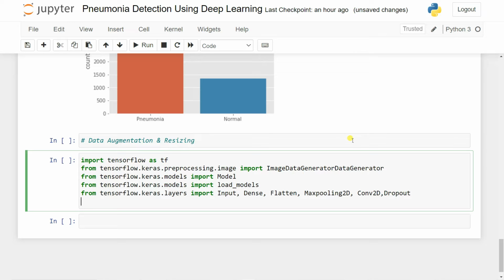If you have an idea about CNN and how you can build a CNN model, you can also use a CNN model to build this pneumonia detection model using deep learning. I also made one tutorial about that before in other projects, like the brain tumor one from two years ago, where I simply used the CNN. But the latest one I uploaded is nothing but about transfer learning. You can also check this out, the same things.